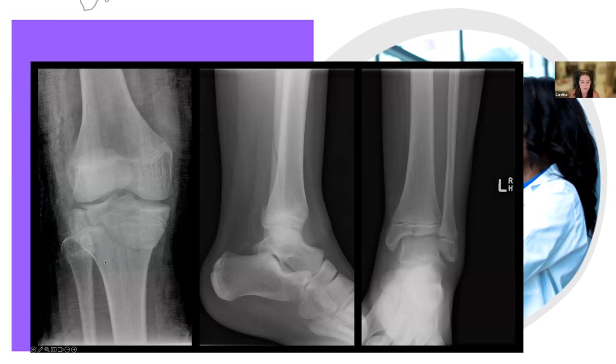So let's go back and do the triplane, which we have here, and then we can do the Tillaux. The triplane or triplanar fractures are fractures specifically of the distal tibia. Here we have the proximal tibia, so we cannot call this a triplane fracture. It's specific to the distal tibia, and somewhat like in a Tillaux fracture, there is a physiological closure of the physis, or the physeal plate, in the medial aspect of the distal tibia, and the lateral aspect remains open for some time.